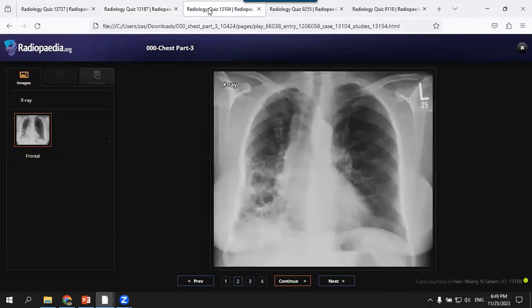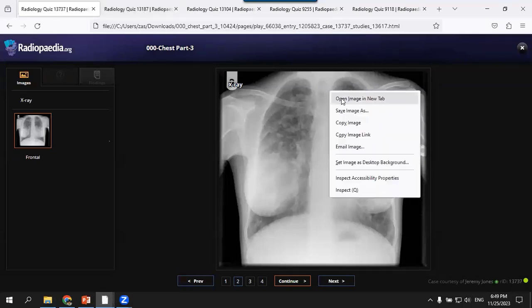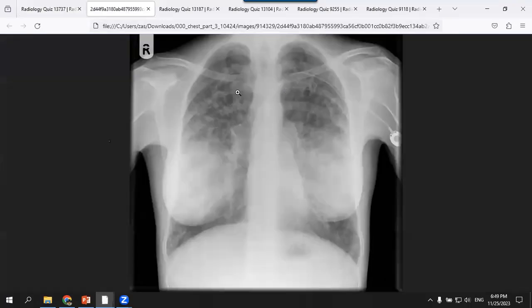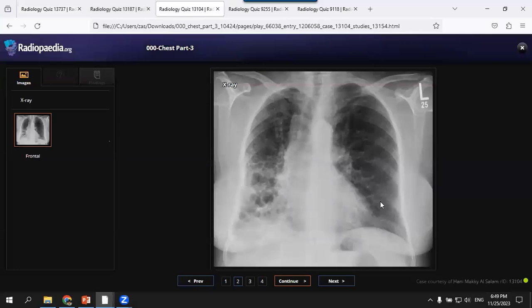Thank you. It was the cystic pattern. Now we talk about bronchiectasis. The predominant pattern here is cystic. The next candidate, it's easy. I think three easy cases. Who will be next? I'm candidate 8. Okay, you are lucky.